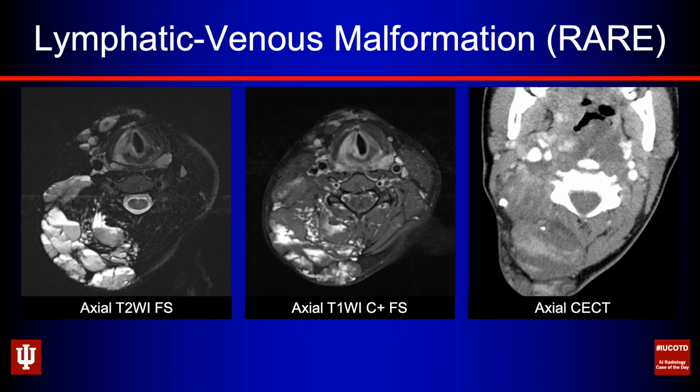So this has fluid levels on the T2 weighted image. That's a feature that we oftentimes see with lymphatic malformations. It does show true areas of enhancement. A lymphatic malformation may have some peripheral faint enhancement, and when they aggregate together like a multi-cystic kind of look, it can look like internal septal enhancement, but that's usually quite fine. Microcystic lymphatic malformations, because their little cysts are so tightly packed and so small, it can give it more of an enhancing look, but that looks different than this.